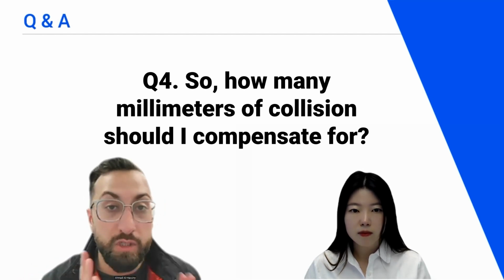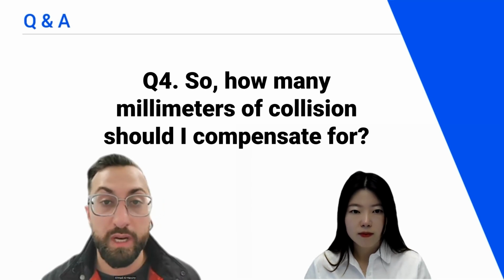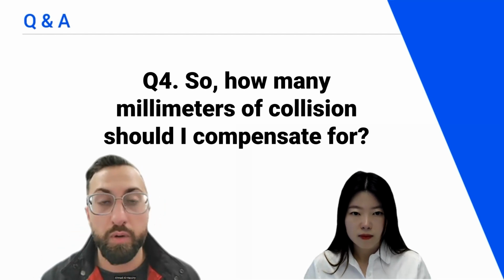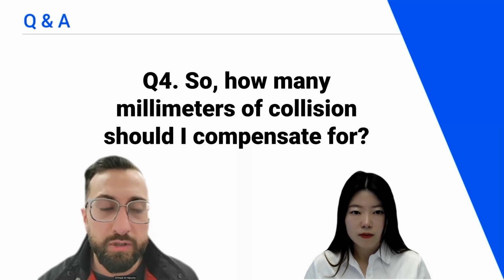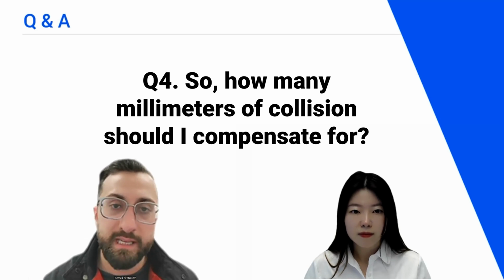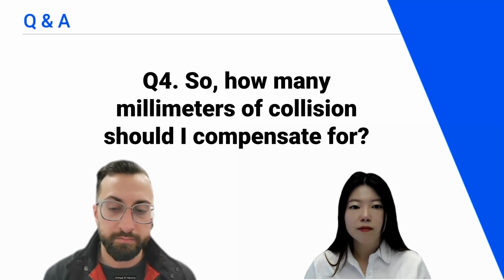If you've taken 2 bite scans and this is happening, rescan, just delete the scans and do it again. But if you've only taken 1 scan on one side, do the opposing side. And that's really the solution for most intersection issues that I find, especially recently because Medit released that mandibular and occlusal analysis that happens after you take 2 scans. This happens automatically and it helps reduce any intersections.